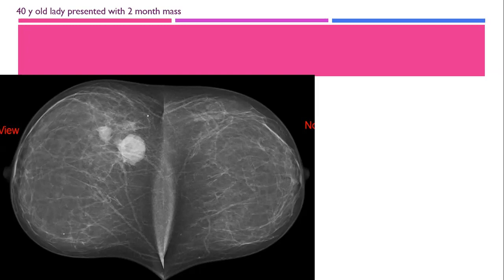It showed her breast parenchyma to be in ACR category A. Excellent. It showed multiple masses.